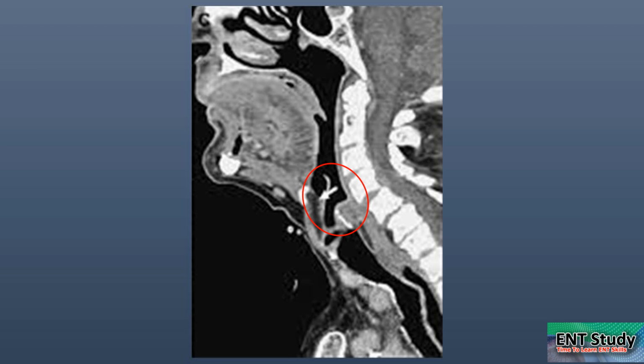And again, now starting from there, which is this area? Yes. The aryepiglottic folds are on the side, son, they won't be much anteriorly. This is the aryepiglottic fold. Okay, then this is the supraglottic area, and this is the glottic, and this is the subglottis. So these are the areas where we concentrate upon.